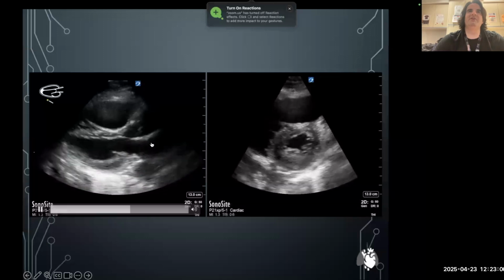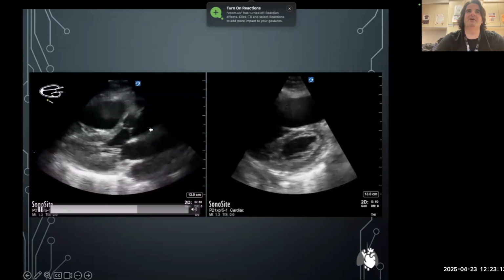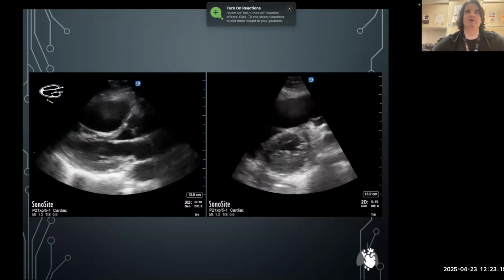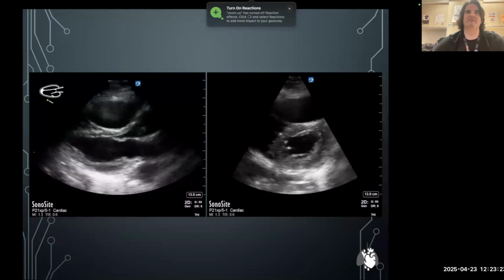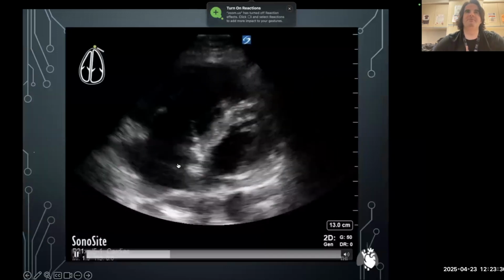Regardless, it's really hard to separate volume versus pressure overload on septal movements. But given the RV dilation, given the story, my bet would be on pressure overload. And pressure overload does cause persistent flattening through systole and diastole. It's just more flat during systole. So big RV, hyperdynamic LV, okay, some change in the septum.